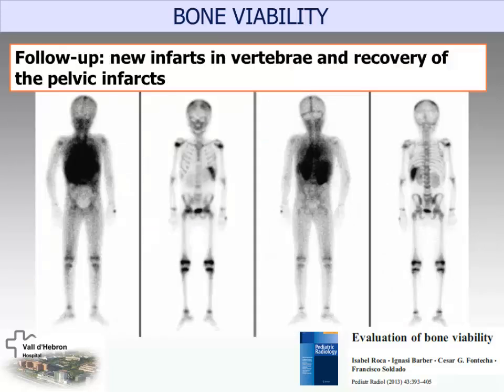In the follow-up, the child came again 2 years later with another crisis of drepanocytic red cells. And now, what happened? We found new infarcts in the vertebra and recovery of the pelvic infarcts. Okay.